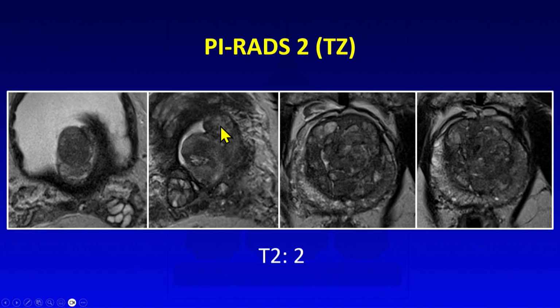Yeah, this is what I mean. A lot of the times you get prostates that look more like this. So then the challenge becomes to pick out the nodule that really looks different from everyone else. As long as everything kind of looks like everything else, I let it go. Because otherwise you're going to call a lesion on everybody in the transition zone.